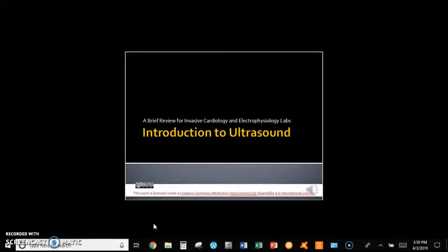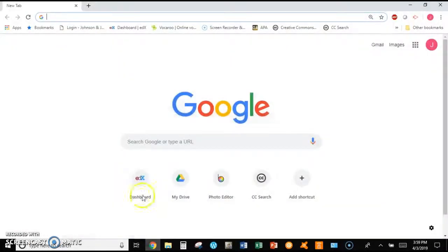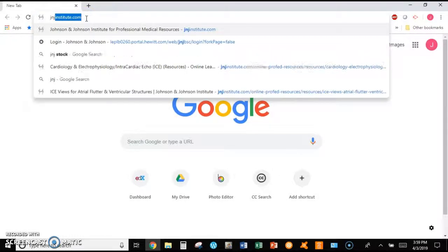To continue with our third and final module, we're going to look at a free resource online to assist you with identifying cardiac anatomy when using intracardiac ultrasound, otherwise known as ICE. To begin, open Chrome or any other browser of your choice and type in jnjinstitute.com.